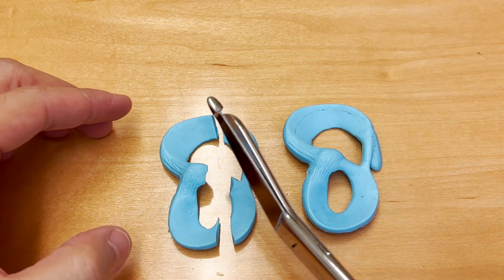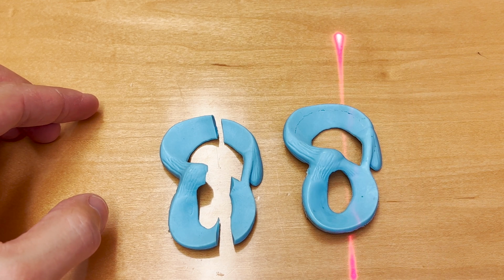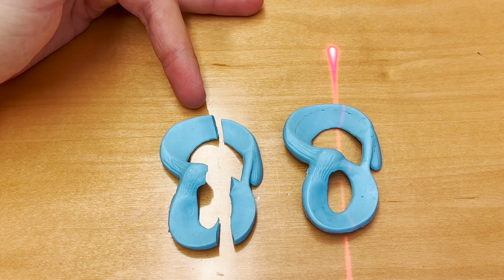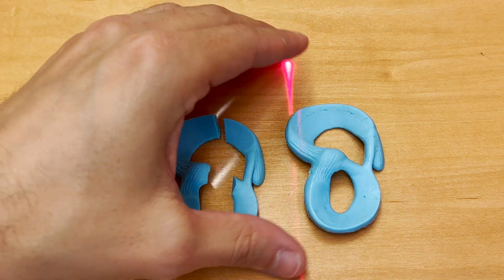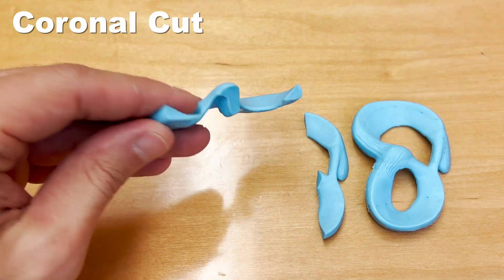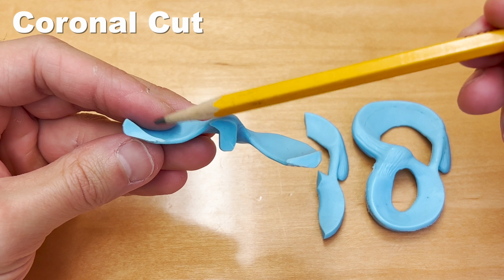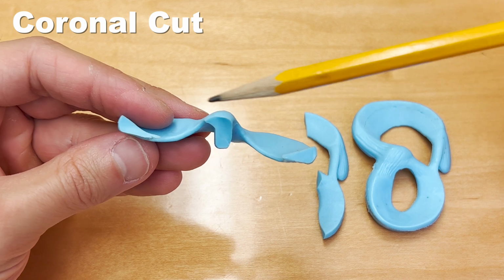For this example, I used my scissors to make a cut through the meniscus about like this. So imagine the intact meniscus is over here on the right, and then I've made my cut through this meniscus, through this part of the meniscus just like this. This would produce a coronal image, and there's where our cut is oriented. If I then take my meniscus and rotate it around, we can see the cross section.